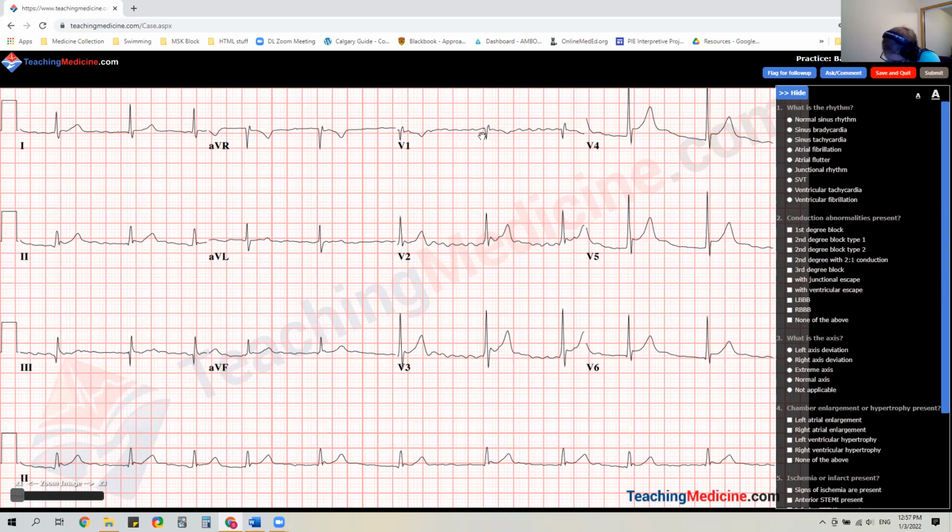So let's check the Q waves. And for bundle branch blocks, it just doesn't look very likely. This doesn't look wide enough. Looks like 2 squares, 1 square, maybe 2 squares. So it's not really wide enough for bundle branch block. So checking out Q, ST, T, and R. Lateral, inferior, anterior, and the interpretation.